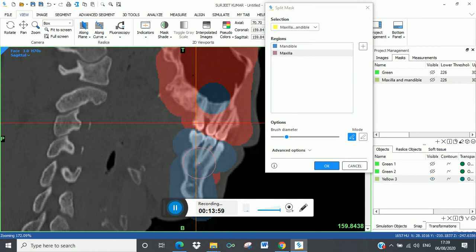What this indicates is, of course you can deselect, you can erase. I will again erase this marking and I'll redo this first. Okay. So what I wanted to highlight is pink, blue is your primary mask and pink is your secondary mask. So anything that you draw in primary mask can be overlapped with the secondary mask, but the secondary mask cannot be overlapped on the primary mask, basically, right?